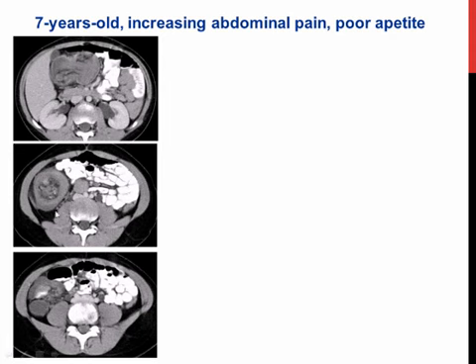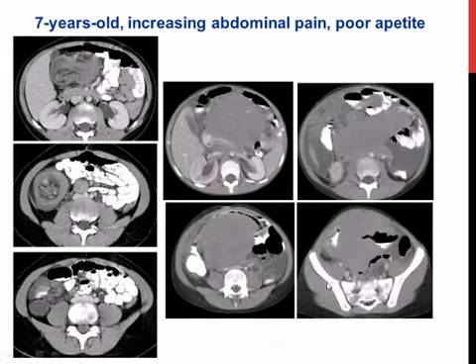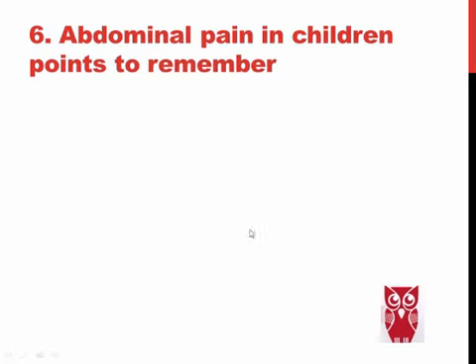So together with the intussusception, we found a lot of trapped mesenteric nodes in and around the intussusception and retroperitoneal nodes. These surgeons biopsied probably these nodes, and biopsy came back negative, and 2 months later this is lymphomatosis peritonei with a large lymphomatous small bowel mass, and a large retroperitoneal lymphomatous mass.